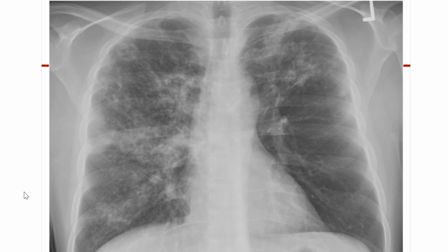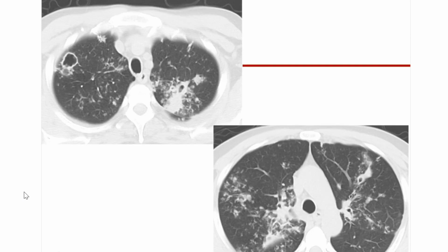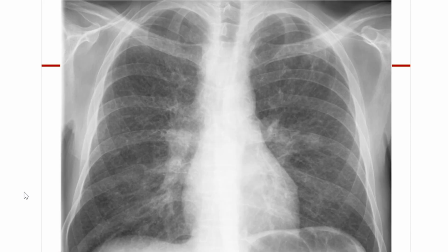I love this x-ray, and it is a true story. This is the x-ray of a bus driver in New York City, on one of the most popular bus lines for tourism. And I think all of us are like, uh-oh, there's a cavitation over here, there's small little nodules everywhere, all right, and this is his CT scan, and this is his reactivation TB, and it really was a bus driver in New York City.